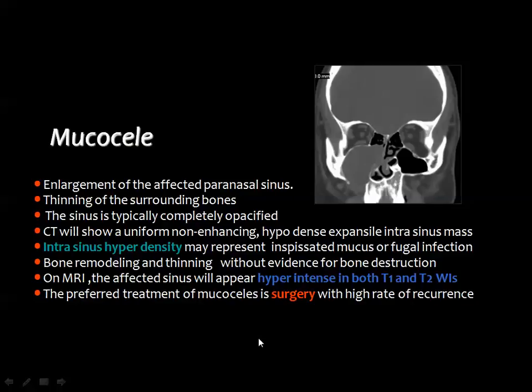If you see hyperdensities inside the sinus, which is involved by a mucocele, then you may think of fungal infection that may complicate long-standing retention of the secretions.